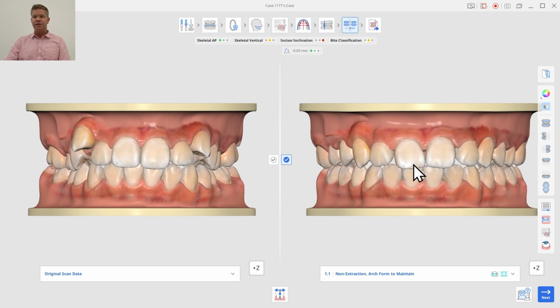And in this case, you can see I've adjusted this so that it didn't find the center axis of the tooth on this 1-1. This occasionally will occur, and there's a variety of reasons that the software has a hard time finding the center axis of the tooth. Sometimes that's because of a misshapen tooth, or teeth that weren't clean before, so it finds some other objects in that scan, or because the incisal edge has a lot of wear or the tooth is having some issues. So regardless, it's an easy fix. So I can see this one's got an issue.